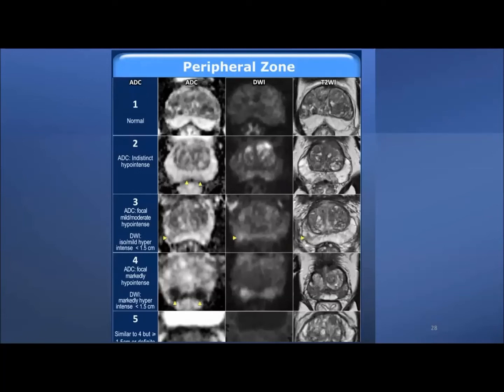And usually they appear heterogeneous, and margins sometimes can be obscured, and like I said, they do not qualify for category 2, 4 or 5 lesions. And for category 4 lesions, which we are interested in because the chances of malignancy are high in this, they usually have a rounded, oval or lenticular shape with a non-circumscribed appearance. They will show hypointensity, which is going to be more intense, more towards the blacker shade, and the size for a category 4 lesion is again less than 15 millimeter.